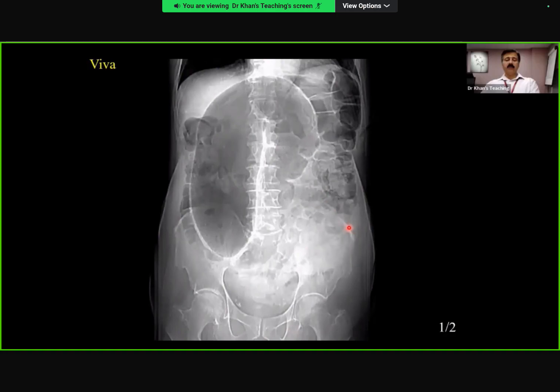Yeah. Okay. Very easy, a spot diagnosis. On this frontal abdominal radiograph of a skeletally mature patient, there's a large gas-filled hollow viscus occupying the right upper quadrant, starting from the right iliac fossa. It hasn't got any haustra within it. I can see some haustra on the left lateral side. So my diagnosis for this is likely to be volvulus, and I can't see any pneumoperitoneum.